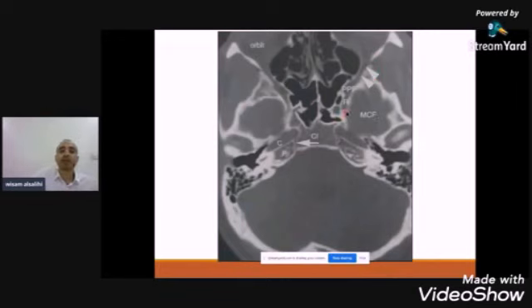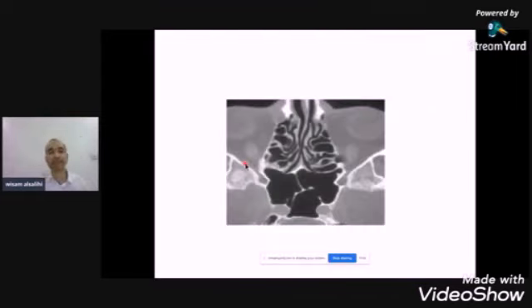More superior showing the foramen rotundum, middle cranial fossa, and V2 transits from the middle cranial fossa through the foramen rotundum to the pterygopalatine fossa to the orbit. This section shows the sphenoid sinus with both carotid arteries and the septa of the sphenoid sinus attached to the carotid.